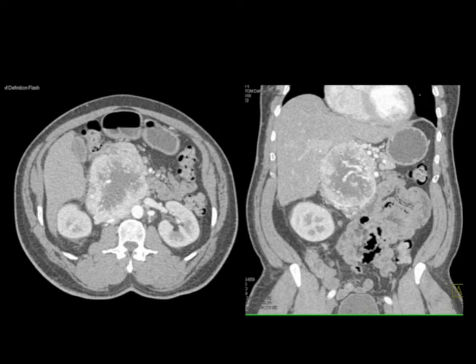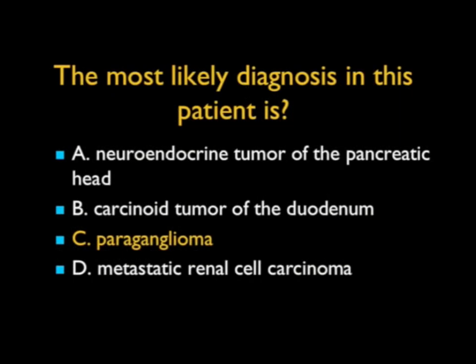We have seen a number of patients with paragangliomas, and this is one of those patients. Hypervascular lesion, central necrosis. Kind of looks near the adrenal bed, but the adrenal would be okay. It looks identical. Remember, paragangliomas are extraadrenal pheochromocytomas. Beautiful example, great location. Peripancreatic, periadrenal. We've seen a number of these. So when you see this appearance and the pancreas looks good, you better be thinking about paragangliomas. Just a wonderful case.